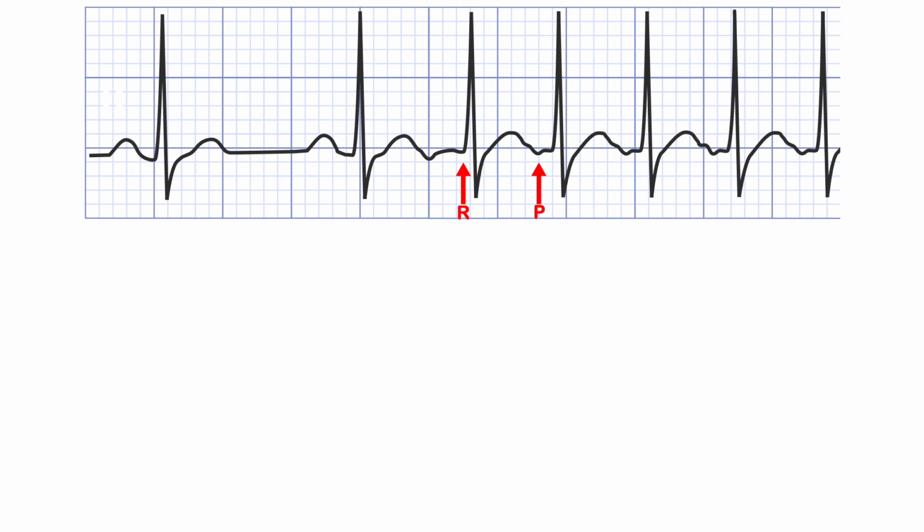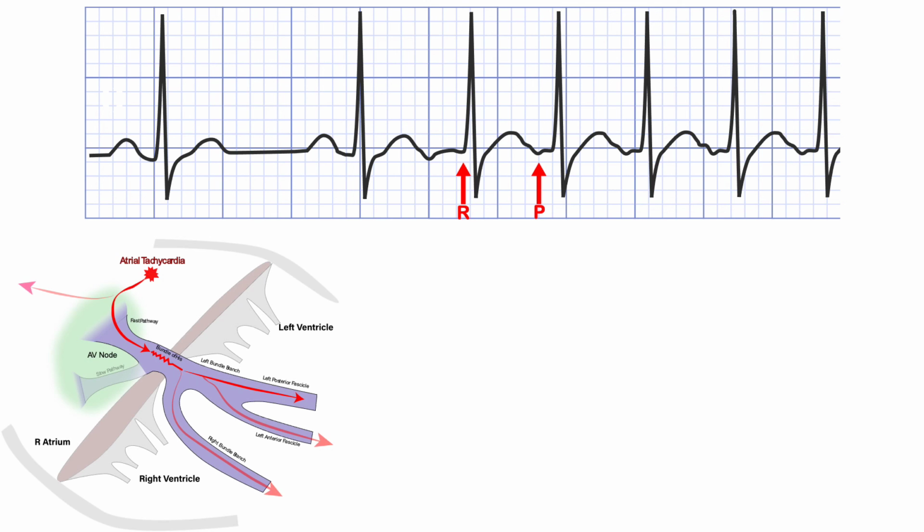Finally, let's look at the case of a long Rp tachycardia and play through all the scenarios. In the case of atrial tachycardia, this could be an atrial tachycardia if this P wave represents atrial activation followed by ventricular activation. Although most would say this interval is far too short to represent a physiologic PR interval. Although it could be long enough, it's hard to say.